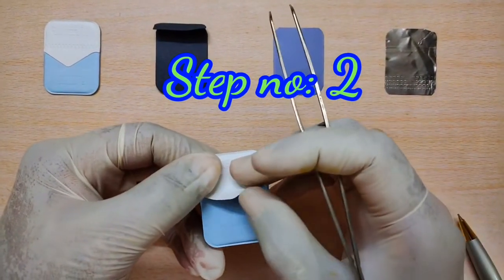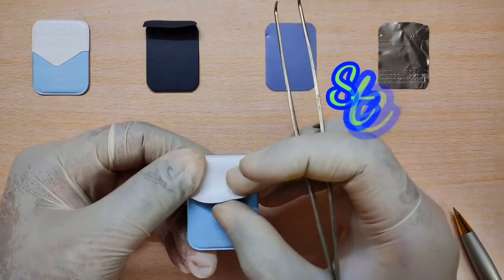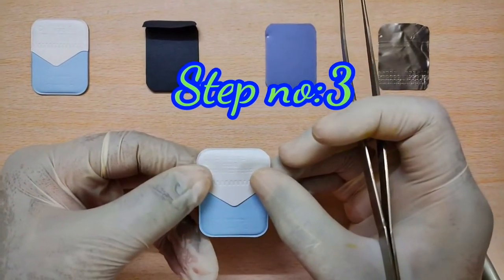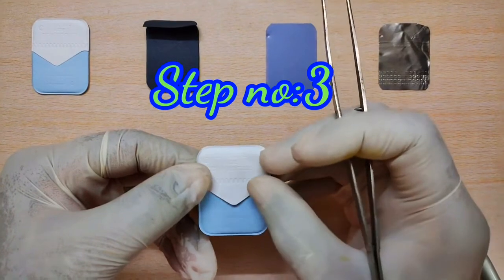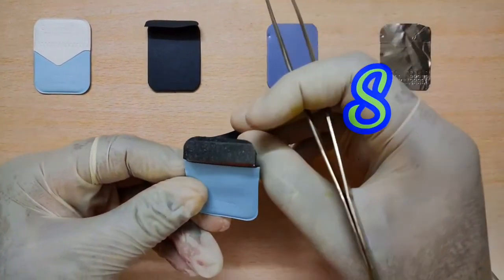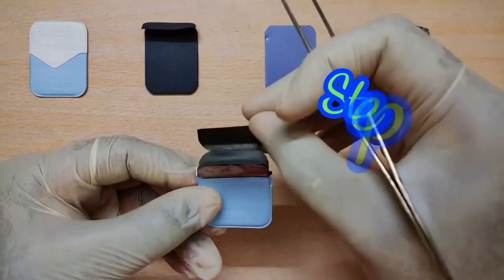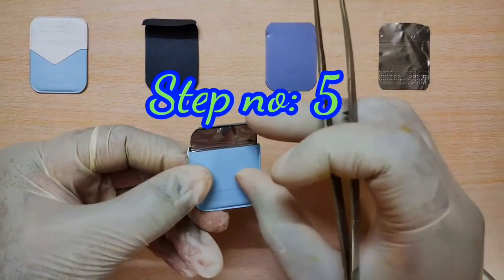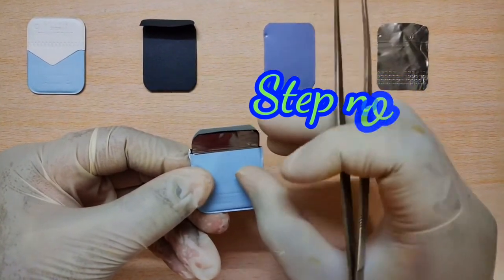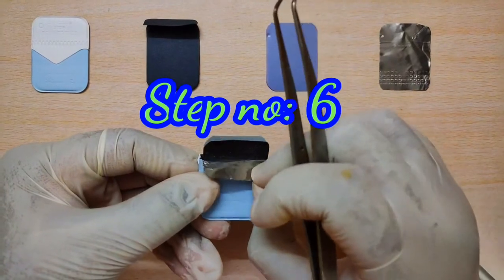Take the label side towards you by feeling the tongue-like flap on top. Now calmly and carefully start to unwrap it. Hold the tongue-like flap and raise it to unfold it opposite to you. Next, unfold the black wrapper opposite to you. Then hold the lead foil backing in front and fold it towards you. Next, fold the backside of the black wrapper towards you.